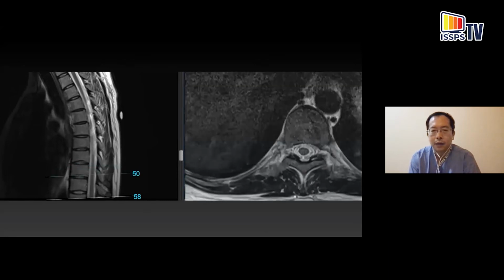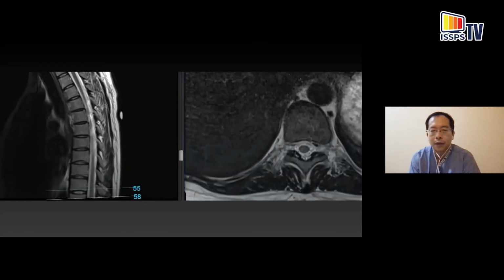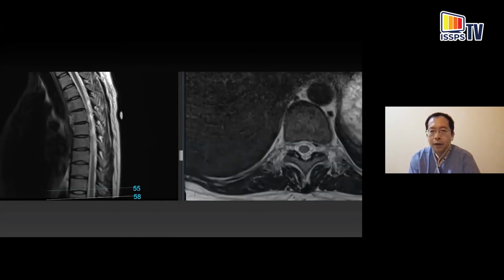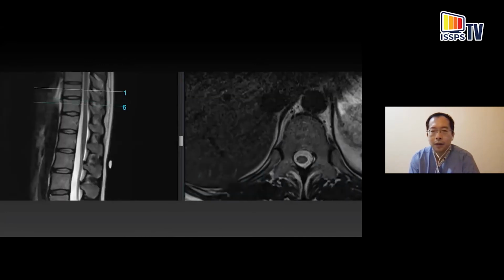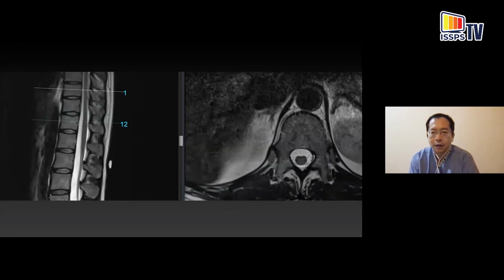And now as we slowly approach the inferior part of the thoracic spine, we're coming up to the T9, T10 level. You can see liver up here. It starts to then resemble again the lumbar spine. So we're coming downwards now. You can see that once again, the transverse processes are now slightly flattened out and very short.